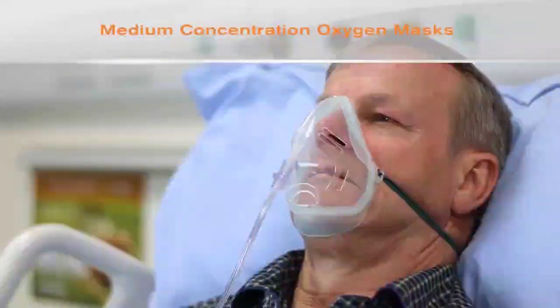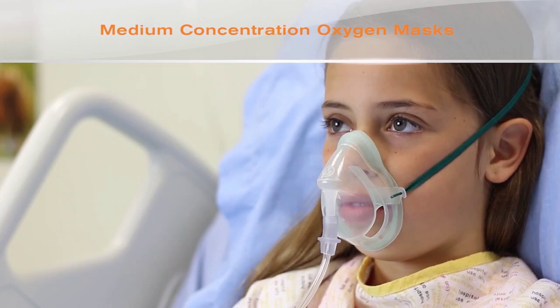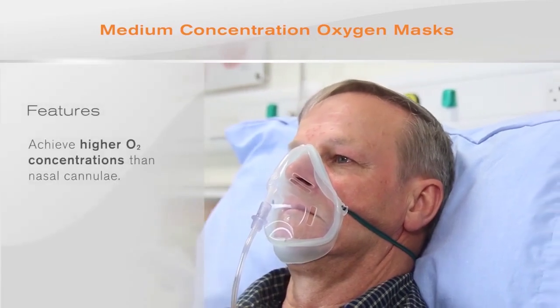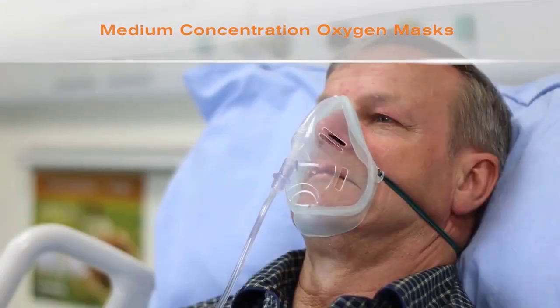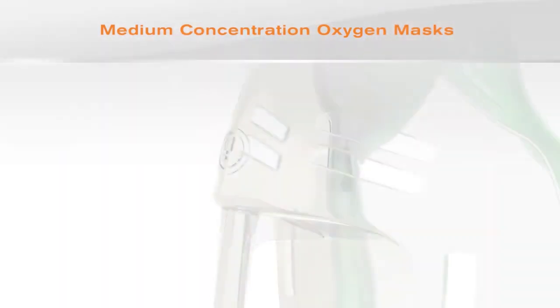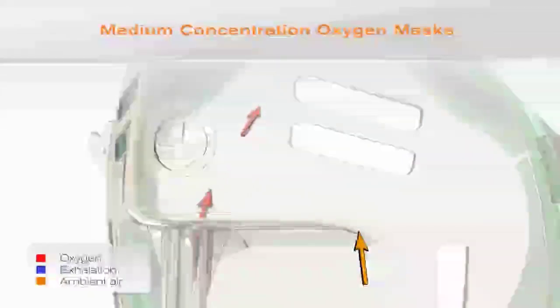Now we can look at medium concentration oxygen masks, which provide another option for the delivery of low-flow oxygen therapy. These may be used for concentrations higher than those that can be achieved with nasal cannula or when the nares are unavailable. These masks are available in adult and paediatric sizes. The arrows demonstrate the manner in which gases are inhaled and exhaled by the patient. The red arrows represent the oxygen delivered to the mask.